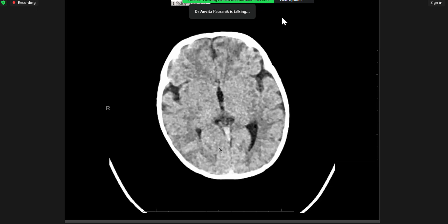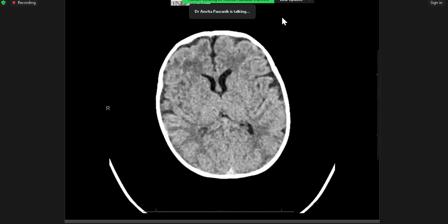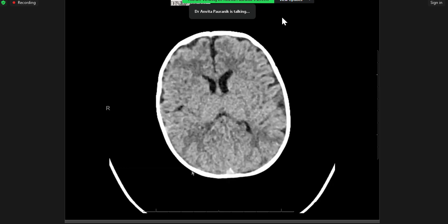So, first case, first patient, there are multiple take home messages here. Number one is when you go back to your hospital, when you have access to your PACS workstation, I want all of you, especially residents and trainees, to get comfortable looking at several, if not tons, like at least 5 or 10 non-contrast CT heads. You can sort by age. In most PACS, you can just do date of birth and open scans of young kids, especially less than 6 months, less than 5 months, especially newborns, and look at the white matter.